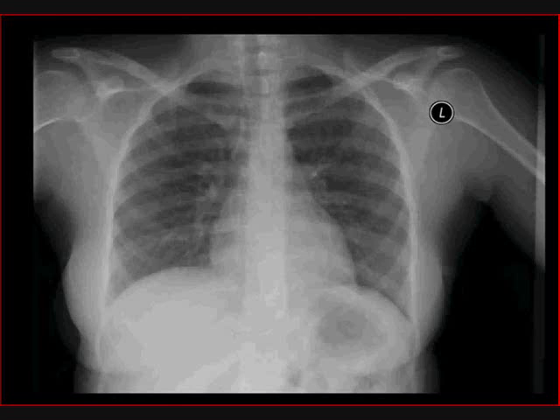Then we move on to the pleural surfaces. So we run along the entire pleural surfaces, along the diaphragm and along the lateral thoracic walls, looking for any abnormal thickening or the accumulation of fluid. And in this case, the pleural surfaces are clear.